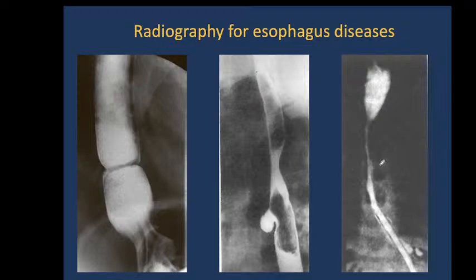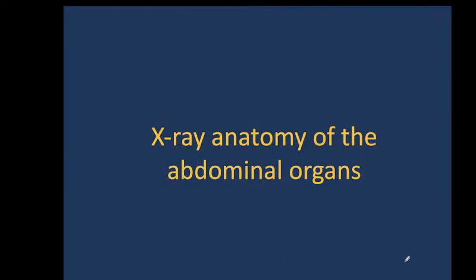It may also be alkaline or some very hard product. Mostly this is chemical stenosis after taking acid inside, and you see that there is a narrowing in the middle part of the esophagus, and food also couldn't pass through the esophagus.